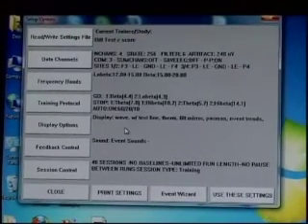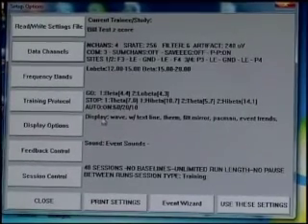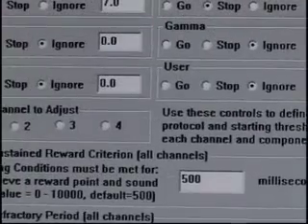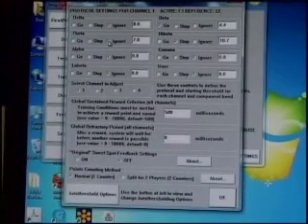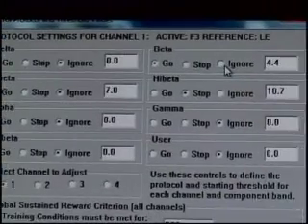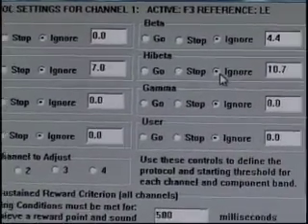Everything else is pretty good. There's some things that I'd like to turn off because we're doing z-score. Notice, because we started with a generic settings file, we have standard amplitude-based protocol set. Now we don't want that. So we go training control, and then we make sure everything is on ignore. As we go down the list of ignores, and we're over on the list on the right hand side now, we just go ignore, ignore.